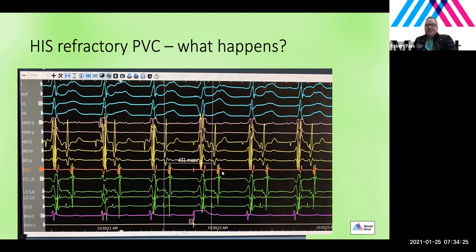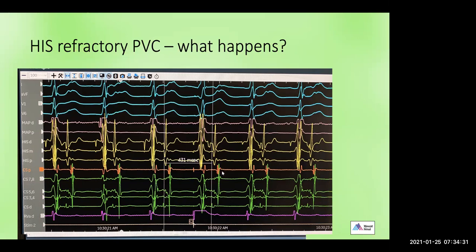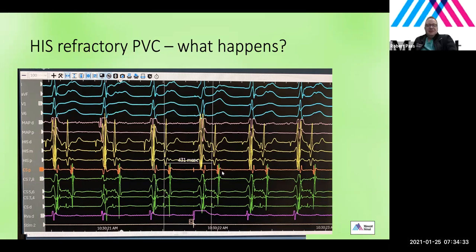Excellent. So you must be using Barris's computer, but anyway, you now have a catheter still in the left atrium. You have pre-excitation on a left-sided pathway, albeit a low-risk pathway. It does not conduct retrograde, and you have atypical AVNRT. And this is now your third time in the cath lab with this poor young person.